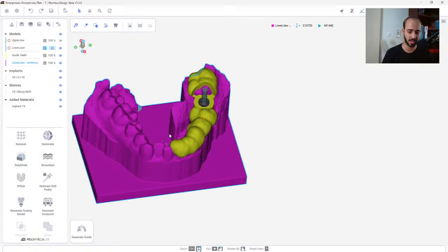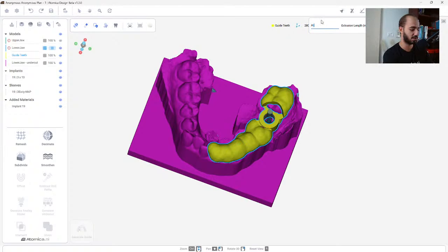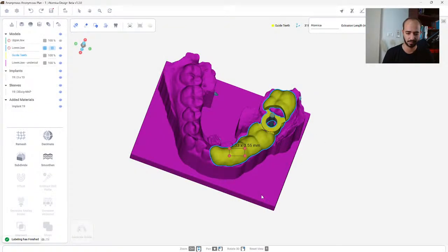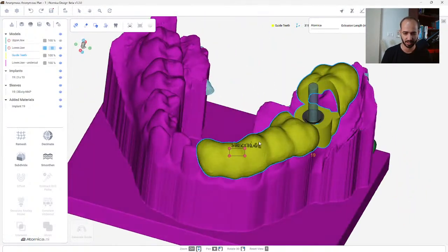And if you wanted to personalize that a little bit more, there's another feature that I like to use right here. It's called labeling, that I can personalize that if I wanted to name it under our company, for example. Selecting the area like that. So if you tick that box, it will engrave inside your guide. If you uncheck it, it will emboss out, as you'll see right now. So there you go. This is it right here.